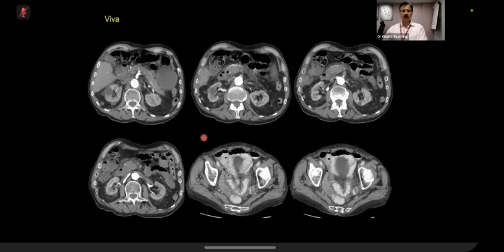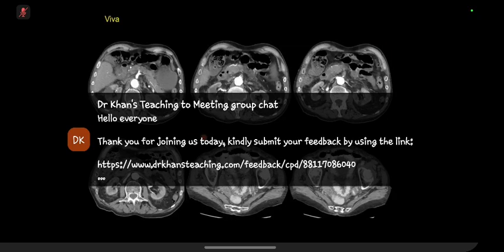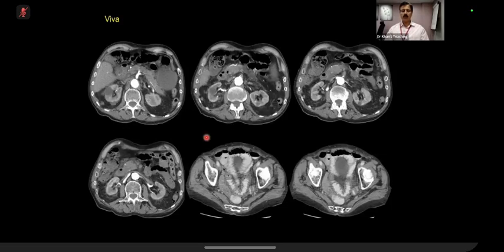Okay, last few films. This is a case of ischemic bowel. What is the key finding? Okay, so there appears to be some gas in the bowel wall. Okay, I'm not interested. Anything else? The bowel wall appears to be thickened. Anything else? So what I'm trying to teach you is that when you get a case of ischemic bowel, which is a very important exam case, there will be pertinent negatives and positives.